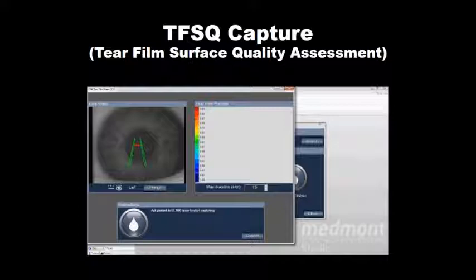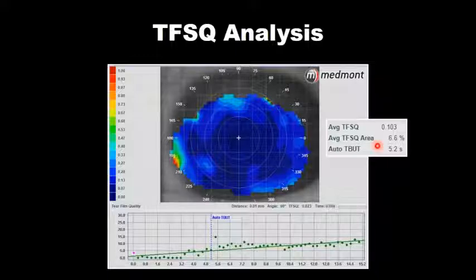So we want much more of that peripheral cornea. If we're using a scleral, then of course we want to use some of this peripheral corneal and limbal shape to best predict the scleral lens diameter and the scleral lens depth that we might need. So I believe so strongly in this composite capture and its value in all of our modern specialty contact lenses today.